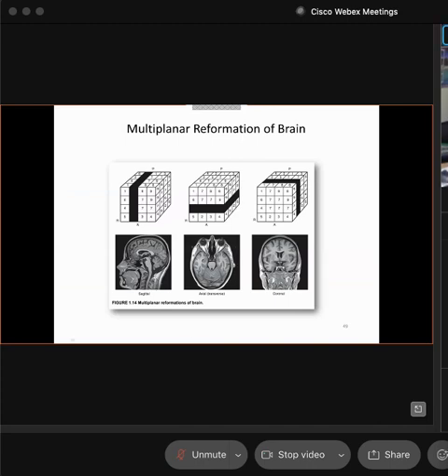The left side of the patient still corresponds to our right side. Same way if we were looking at it coronal, correct? Coronal, this is the left side of the patient. We're not changing the way that we view the radiographs in a coronal image, so we're not changing the view of left side over right side in an axial image.